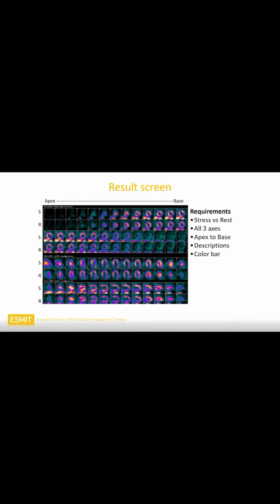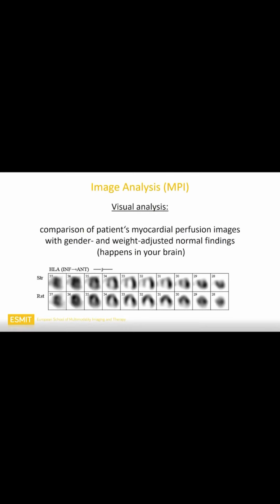And again, we have to describe the different defects from each image, but also to get the color bar, because the scale is very important. We have to check by two scales. Sometimes it's what we call gray or black and white, or maybe the cool images. And it's very important to get this kind of linear scale to be sure that we have some defects and not another thing.